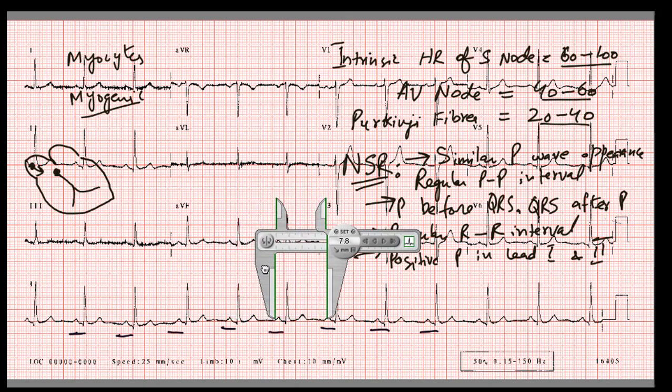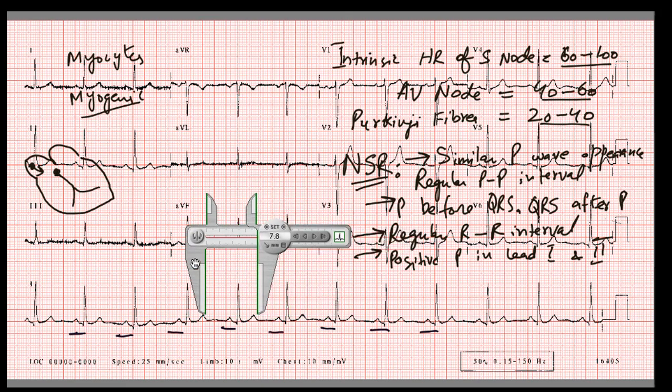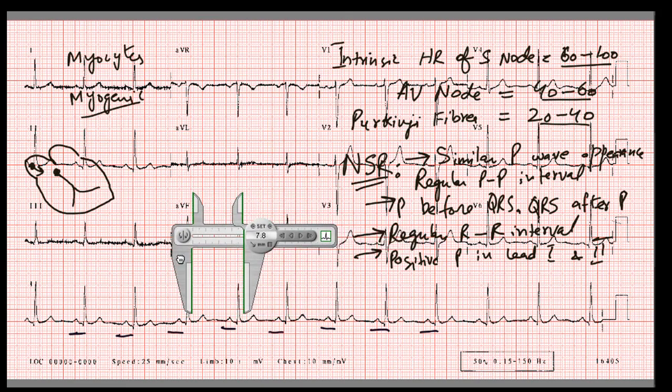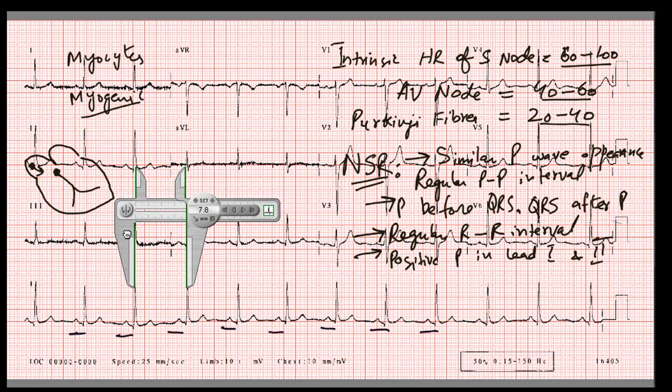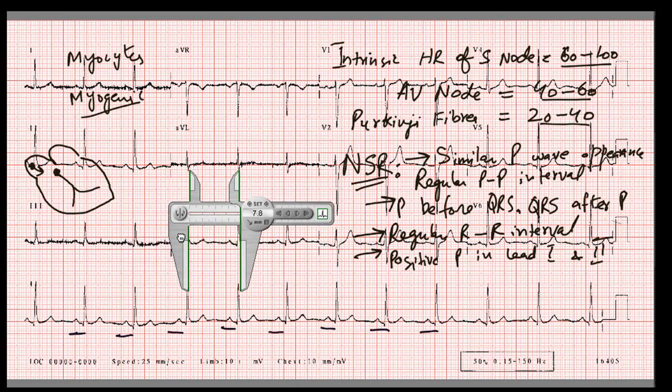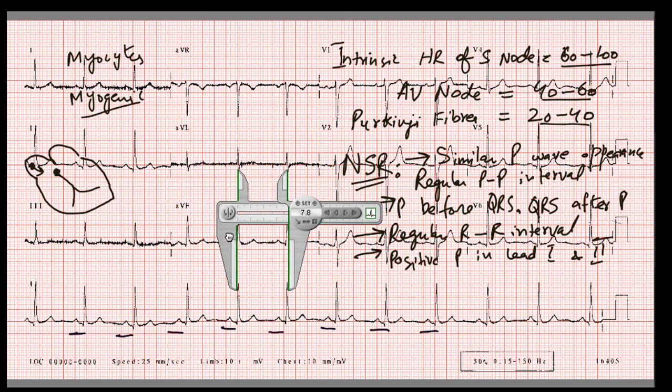The third criteria is a regular R to R interval. Let me adjust it here again on R waves. This is the R to R interval, and yes, it's regular.